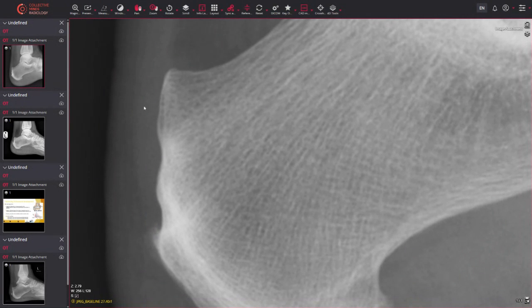So this is the Achilles tendon coming in here. And we've got repetitive strain again happening at that tendon insertion, which is causing this new bone formation, this enthesopathy here. We do have a bit of sclerosis callus there as well at the cortical region. If you compare this to the rest of the cortex, we've got some increased sclerosis there.